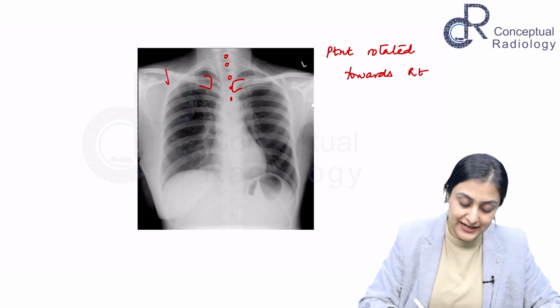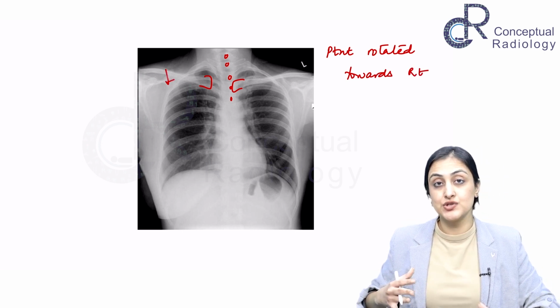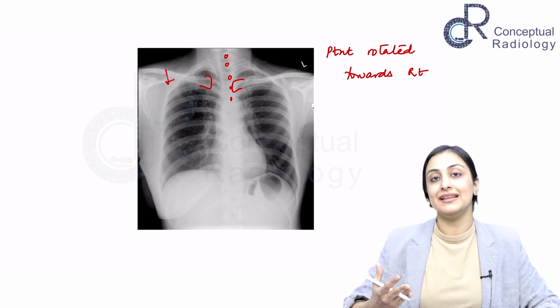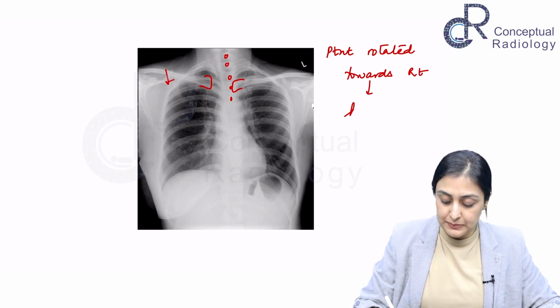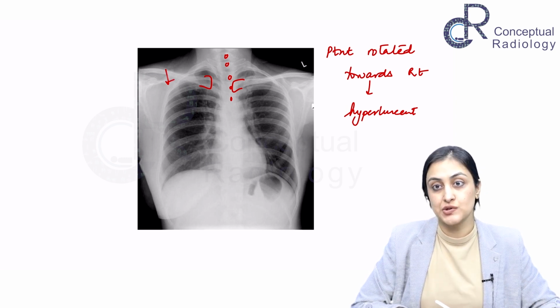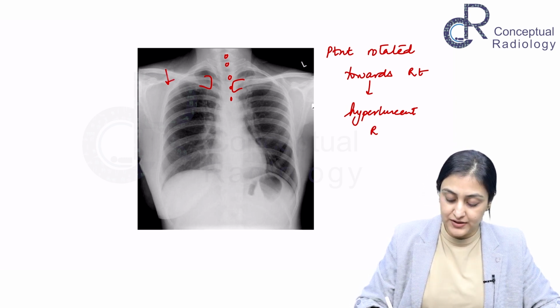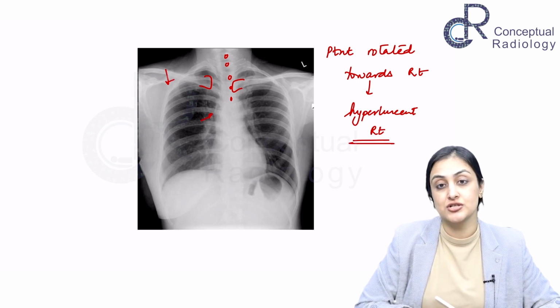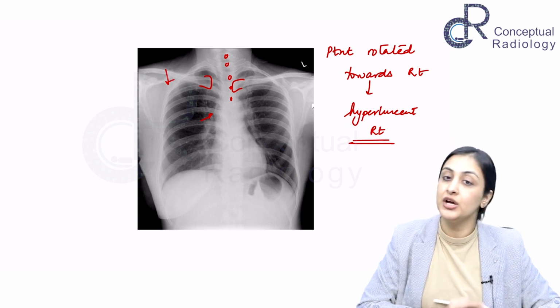the right side of the chest appears hyperlucent. A shorter distance of X-ray travels through the patient, and that is why it appears hyperlucent, whereas there is more attenuation on the other side, resulting in a more opaque appearance, right? So there is a hyperlucent right-sided hemithorax. In addition, we see that the right mediastinal structures like the SVC start to appear more prominent.